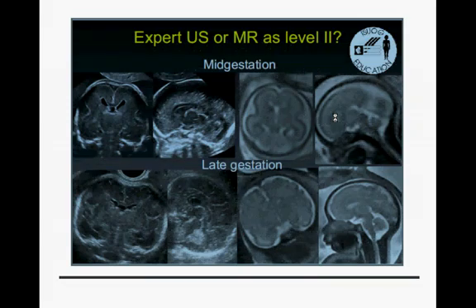When compared with the fetal MRI, this approach, especially with the 4D scan, the evaluation in the coronal and the sagittal plane with the high resolution scanners nowadays available, it's almost comparable. So why don't we make use of that modality?